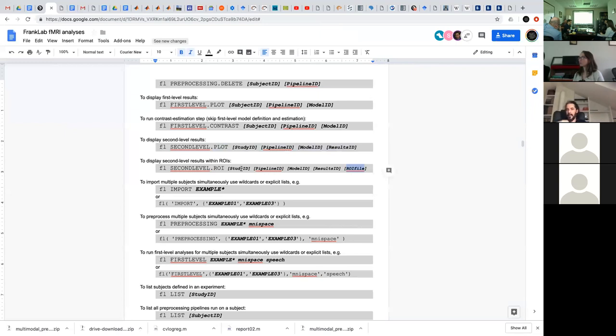That means that's the one created from the 152 range, right? Right. There were two variations. I don't know if Jason... MNI 152 then, and FSL uses the same, so we might be able to.